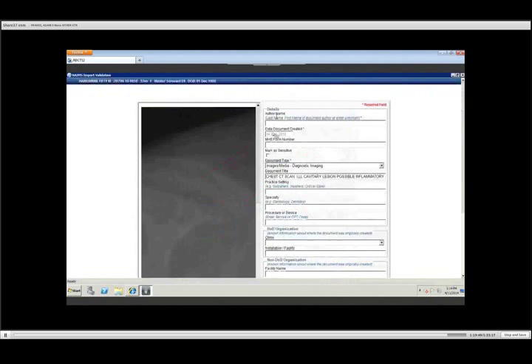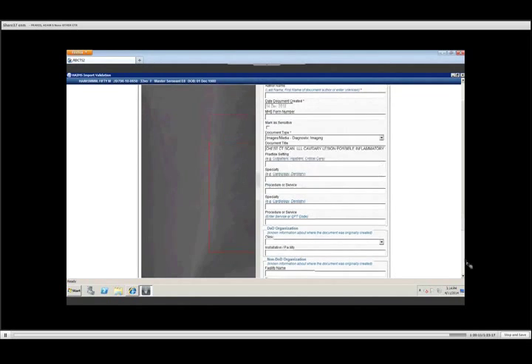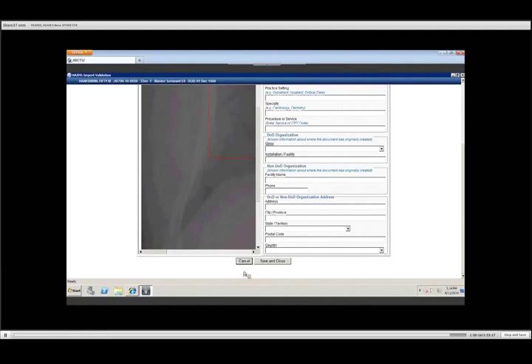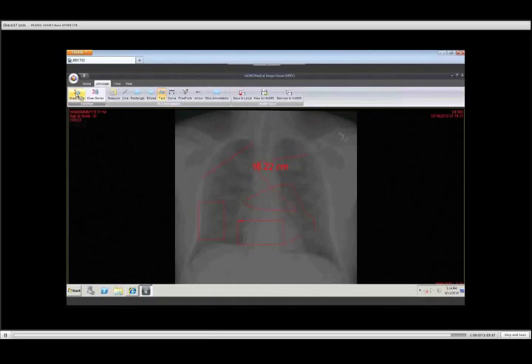It's going to show me the radiograph on the left. Of course, I will need to fill in my metadata. You'll notice the date is automatically in here. The document type loaded for me, and someone has already loaded chest CT scan. At the bottom, I would hit save and close, and it would import it into the HAIMS system as an amended picture or JPEG. When I'm finished, I can clear my slice or clear my series simply by clicking here, and I can start over.